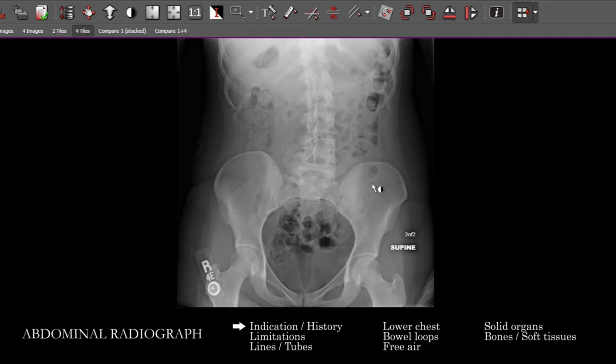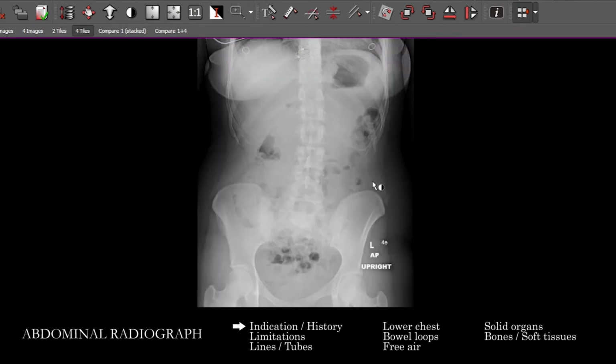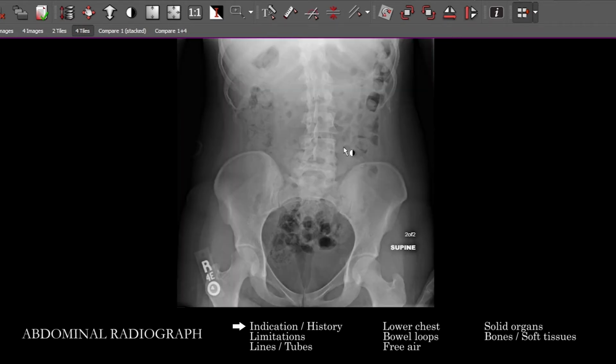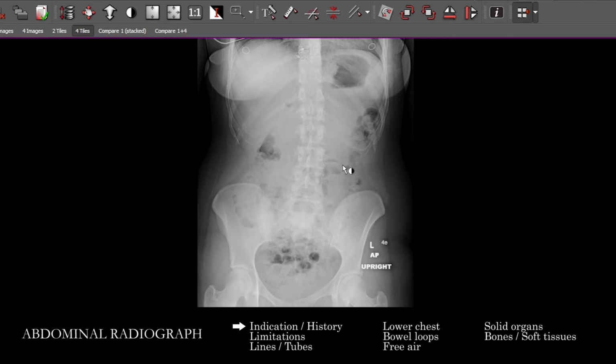Okay, so here is a 3 view of the abdomen in a patient. We'll provide an upright view and 2 supine views, one a little higher, one a little lower. And so if we've done our homework and understand what is going on with this patient, let's just start with the upright view. What I'll typically like to do is take a look at the lower chest, look at the lung bases, note that there's lung behind the diaphragm, look at the parts of the heart you can see. Figure out if you can see the whole diaphragm here. We may lose a little bit of it there.